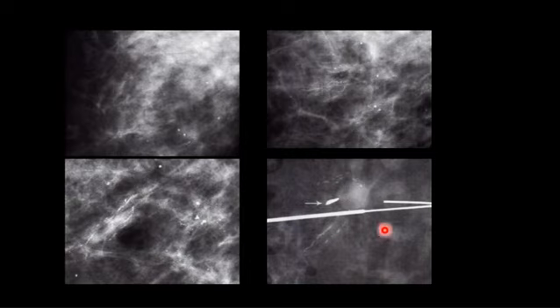You can see here, this is the stereotactic biopsy, the specimen mammogram to confirm that the lesion was excised. This is the first after 6 months magnification view and the specimen radiograph, and this was a high nuclear grade lesion characterized by more rapid time course with a short intraductal phase. It extends from inside the duct, from ductal carcinoma in situ to invasive in a short period of time.